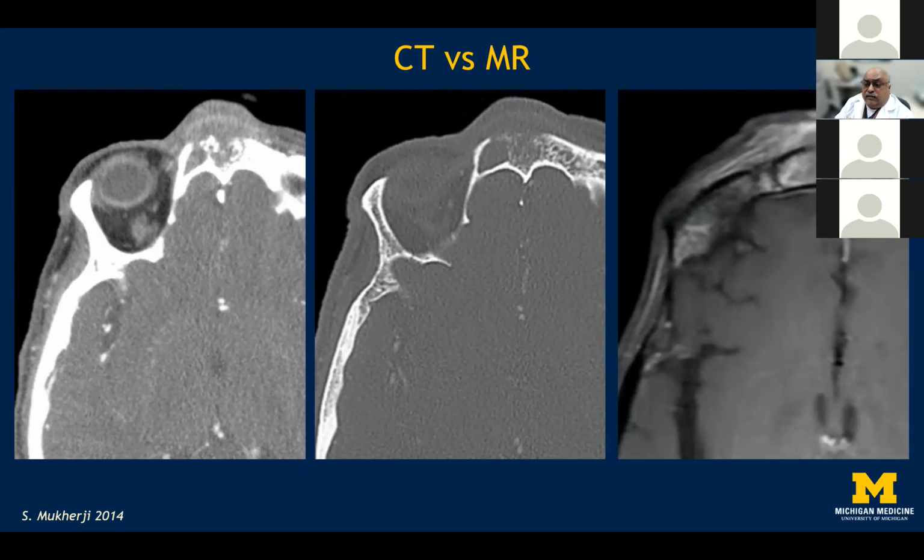However, the MRI offers us a more comprehensive look as to what is happening in this patient. For example, one can see the changes in the marrow spaces of the non-pneumatized portion of the bone. We can also see the erosions of the frontal bone. We can see the components of the soft tissue or the purulent material in the region of the forehead.